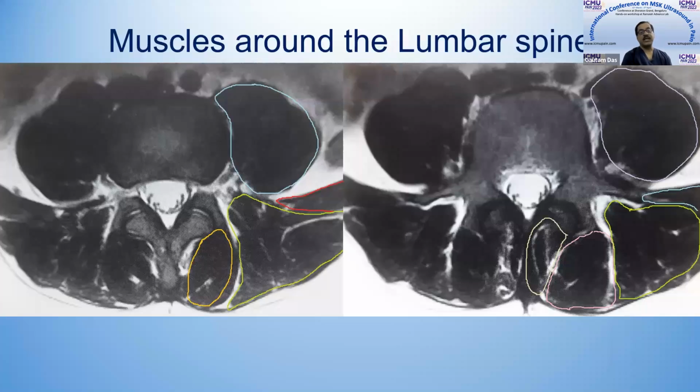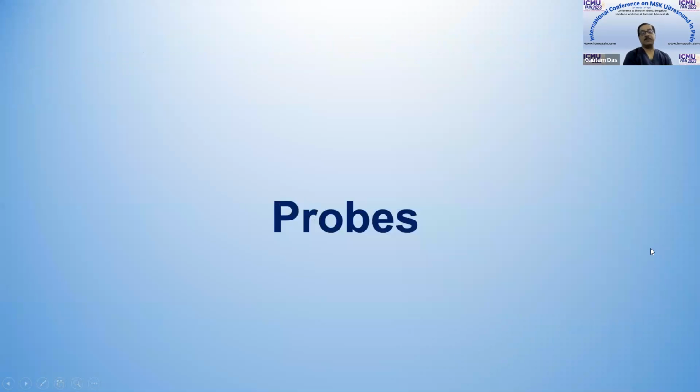Now this is the MRI I was talking about. Look here, transverse process. This makes the three structures very clear and distinct. Anterior to that transverse process is your psoas. Posterior to this transverse process is the erector spinae, and lateral to that, this one here in red, is your quadratus muscle. So quadratus lumborum is basically a thin layer of muscle sandwiched between two layers: psoas anteriorly and erector spinae posteriorly. So this was an MRI picture.